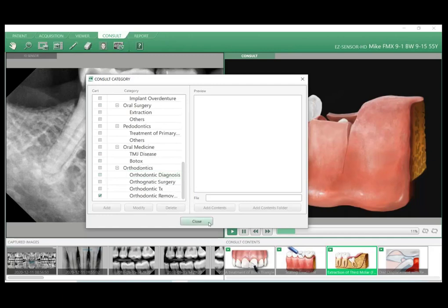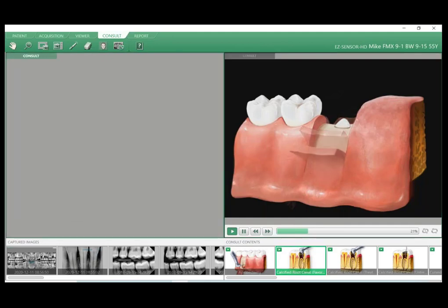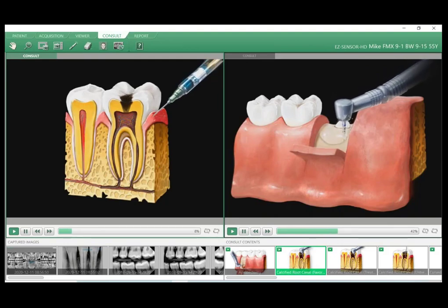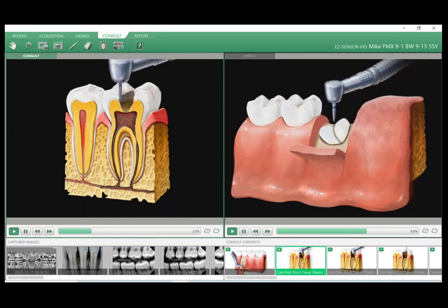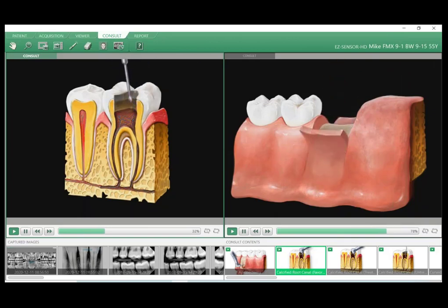They're still in your library. You can always put those back if you need to. So that is one other topic. I think that's all the questions that came out, and you also talked about adding custom videos there. Yeah. But a very powerful tool that is included with your sensor purchase. You get your licenses for your EzDent-i, so you really have a whole library of consult videos that come with the Vatech software there. Right.